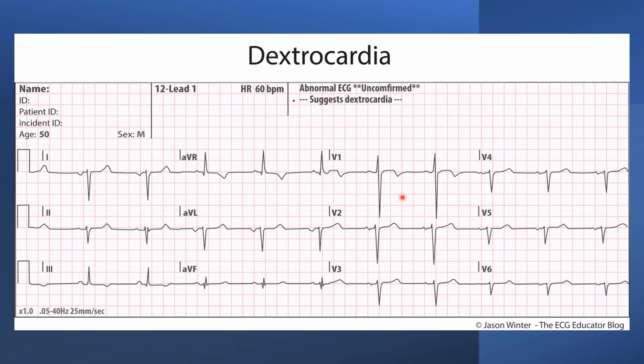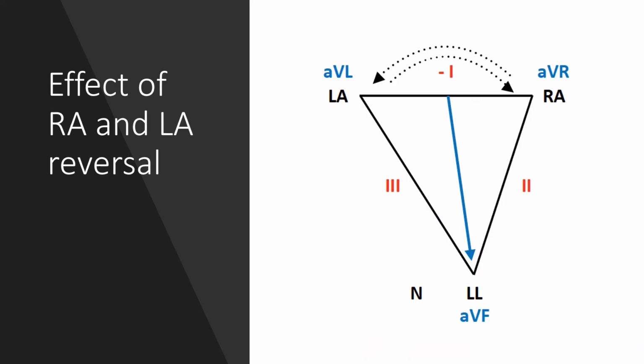Two things. One is the R waves did not completely go away; you still had a big R wave in V5 and V6 in the ECG that you were given. And the second most important finding to discriminate is the negative P waves in a dextrocardia ECG, which you did not see in the ECG that you were given, where you had a positive P wave. So the final choice that you were given is limb and chest lead reversal. I'm going to explain each of these things separately: limb lead reversal first, and then precordial lead reversal.